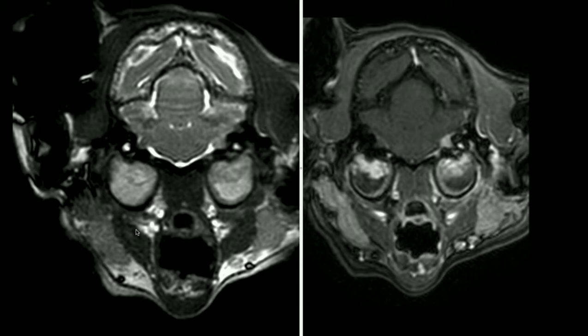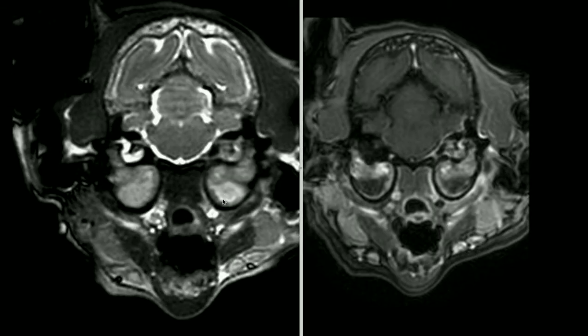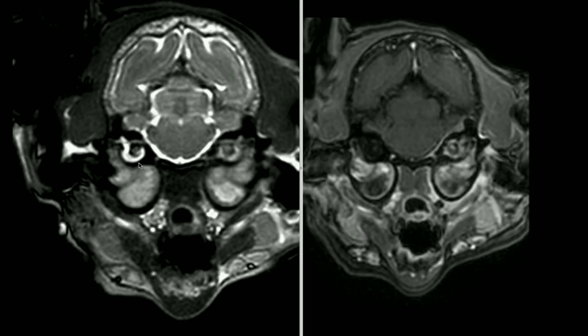So it's great for when we want to assess inner ear pathology. Here we can see very high signal within the lymph and the CSF. The contrast in this type of sequence is slightly unusual, so it's T2 over T1. There's a variety of acronyms for this sequence, which vary depending on the vendor. Some examples would be CISS for Siemens, FIESTA-C for GE.